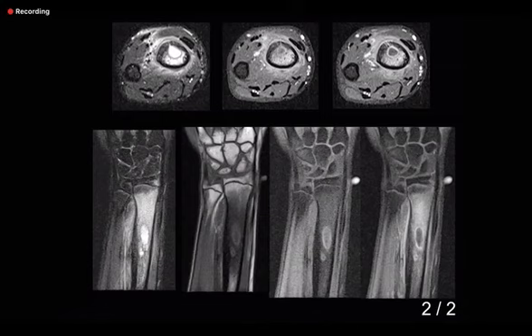Intraosseous abscess. This is an abscess. Penumbra sign, rim enhancement. Ewing's will not behave like this. So keep it to osteomyelitis and do not change your differential. On MR, it was a black and white osteomyelitis case.